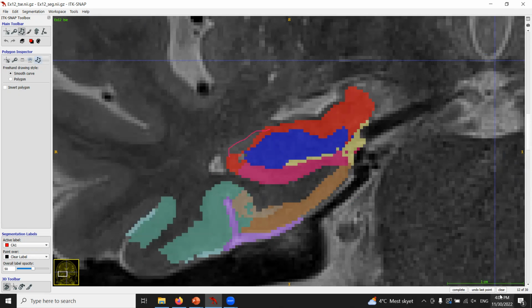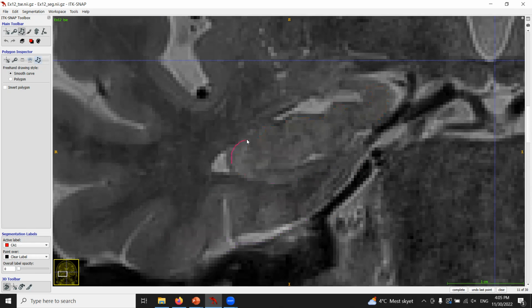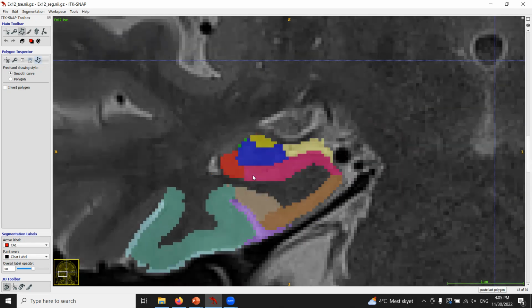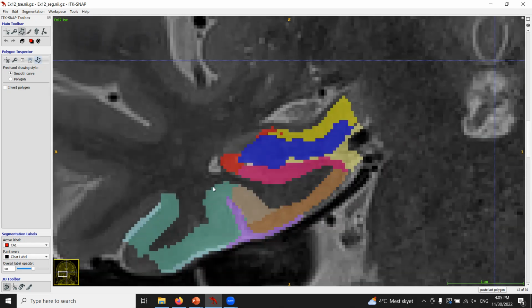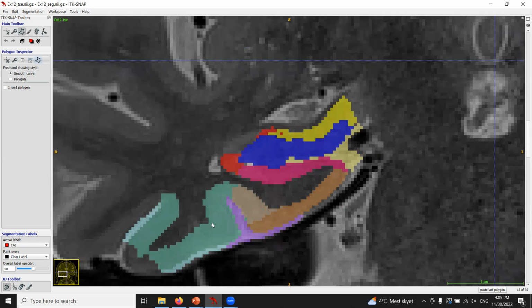So I don't know how many slices that was, but that was quite a lot. It's even here, I would say these are some digitations. So it's still missing there. So it's 1, 2, 3, 4, 5, 6, 7, 8. 8 slices. Not all of them super severe, but most of them have a big missing label. So I would either exclude or correct.